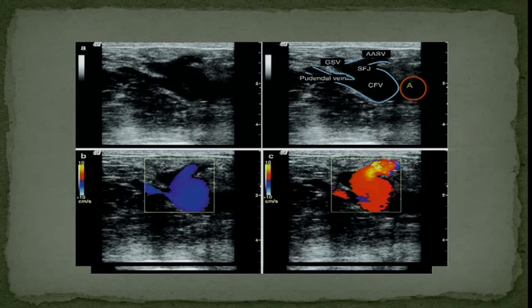It's zoomed in. Anything other than, it's a zoomed in image, so it appears dilated. Is anything abnormal? Let's revise, this is the common femoral vein, which is this.